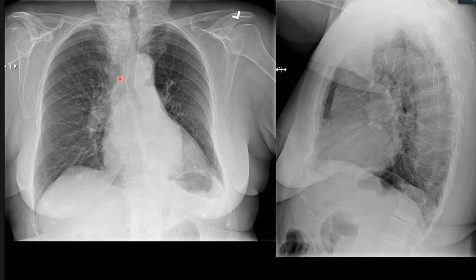So we characterize those lesions, whether they are arising from the posterior mediastinum. Those lesions which would be crossing the clavicle will be from the posterior mediastinum, and they will be reaching the lung. Good. This is a very important question. I got this question on my FCPS part two, so that's why I'm asking you.